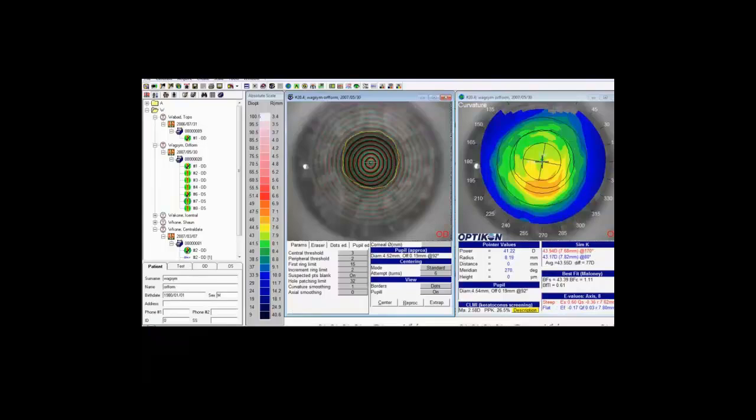And as you'll see, it just swipes that out. If you make a mistake and you want to restore it, just hold your right cursor down as you swipe over and then hit OK, and that will bring some data back. But for this one, I would take it out, hit OK, and then we'll use this data.